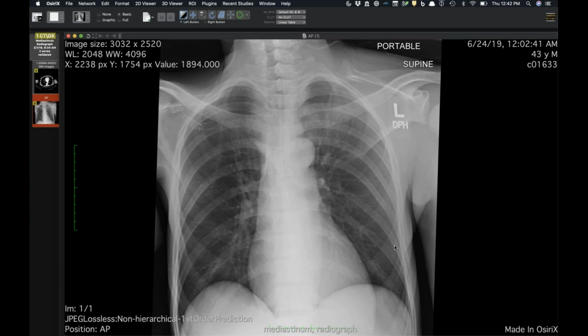I don't know if they're currently on dialysis or not, but that was what I thought this was going to be at first. Yeah, and it looks like there's a bump above the aortic arch. Yep, exactly. So I saw that, and I assumed this was just going to be some tortuous vein, or something else. And just sort of the upper paraspinal region's abnormal. Right. Yeah, there's almost like a little rightward deviation of the trachea. Yeah, I can't tell if the head's tilted or something.